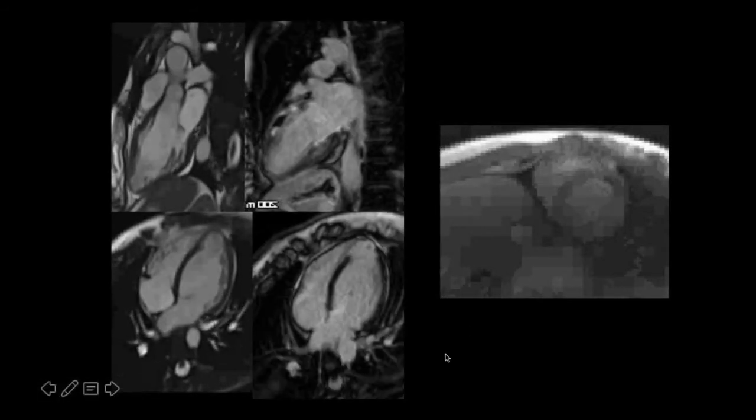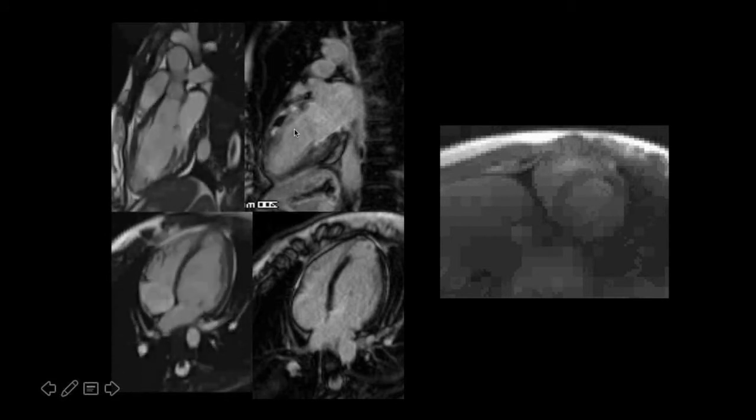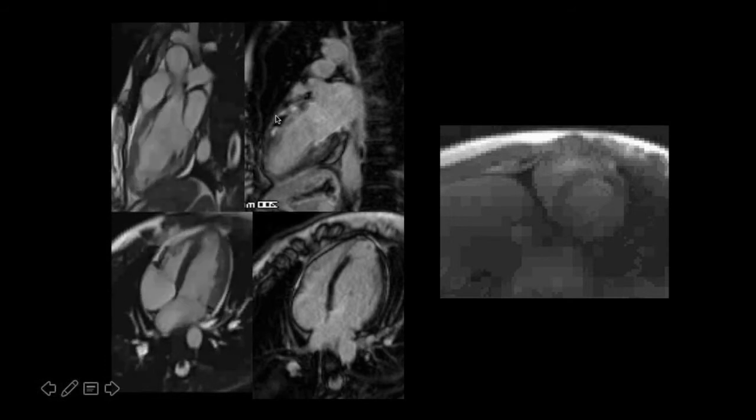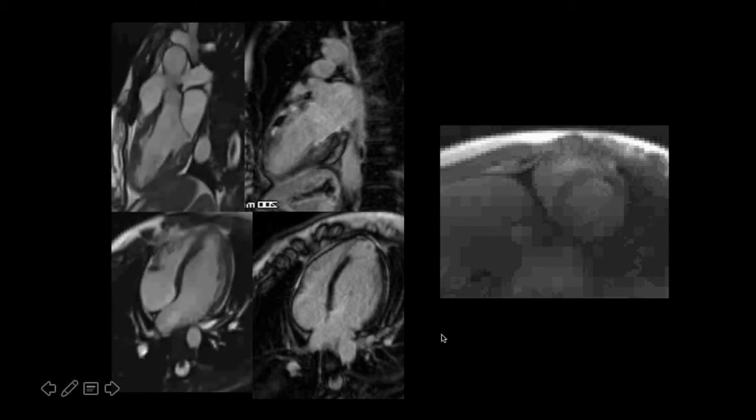And dynamic perfusion here shows significantly reduced perfusion in the anterior wall, kind of mid-wall here. And then delayed enhancement images show pretty much transmural enhancement, distal septum, apex, and in the anterior wall. And here this dark area probably represents an area of, I'm blanking, Jacobo, what's the term I'm looking for? Microvascular occlusion. Yes. Had a sudden senior moment there.